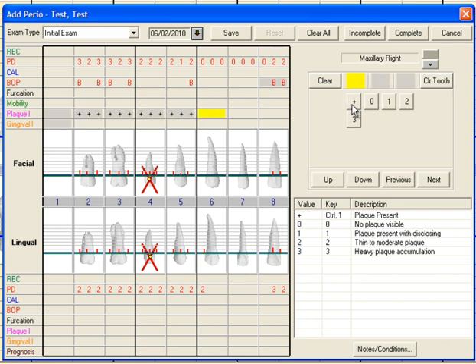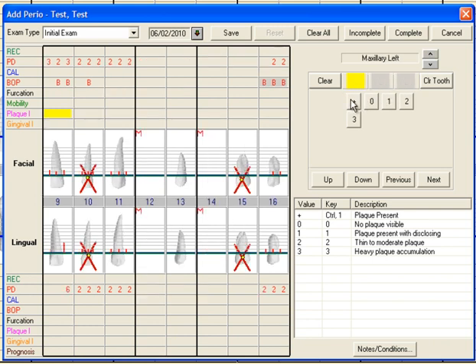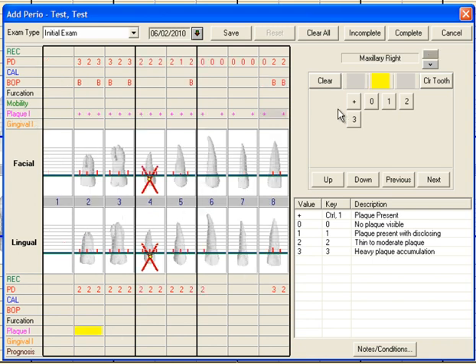Circumferential plaque, boom, plaque there, but guess what? They brushed okay, so I have no plaque recorded there, but the patient here didn't floss, so I've got plaque here at the interproximal again. You'll see this a lot. The patient's brushing okay, it's a smile line. I'm recording interproximal plaque because they haven't been using floss. Just like your gingival index from the palate, I cannot record interproximal sites. It will only allow me to record mid-palatal, and it will default itself to mid-palatal across the entire record.